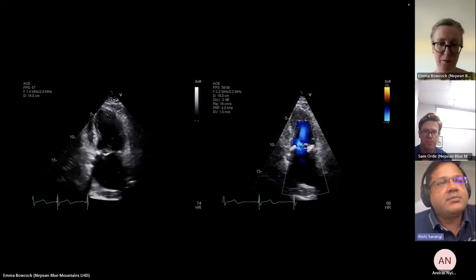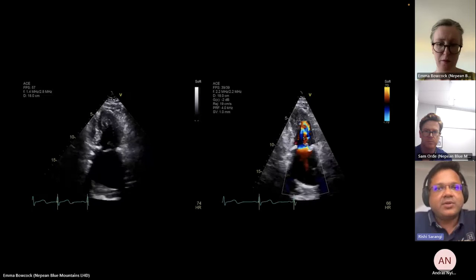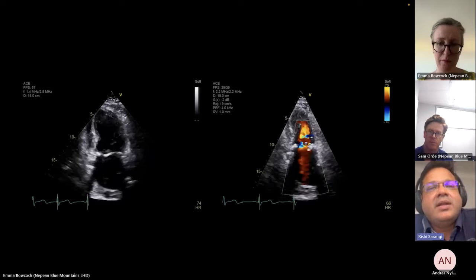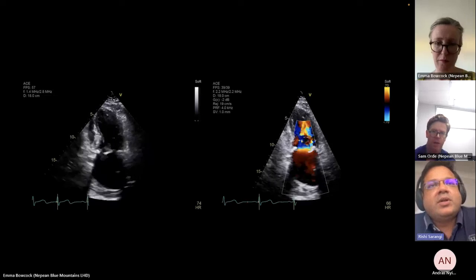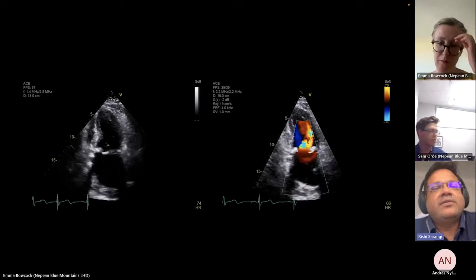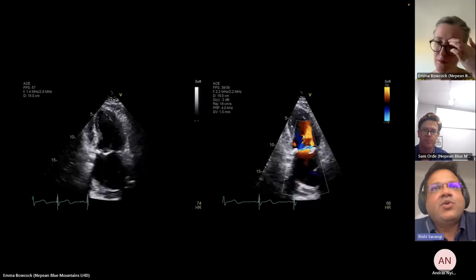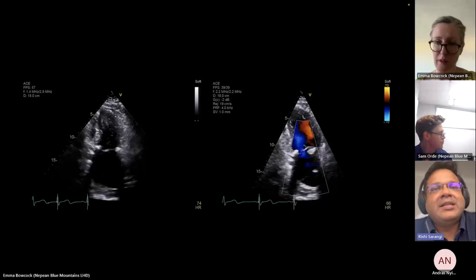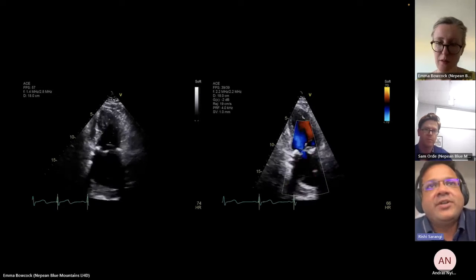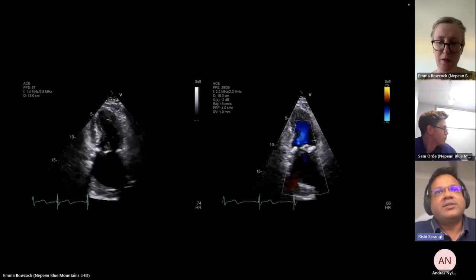I should have commented on the bowing of the left atrium on the previous images. And again, the color Doppler over the 2-chamber view shows flow acceleration across the mitral valve inlet, with reduced mitral valve opening and a very enlarged left atrium, more consistent with mitral valve stenosis.